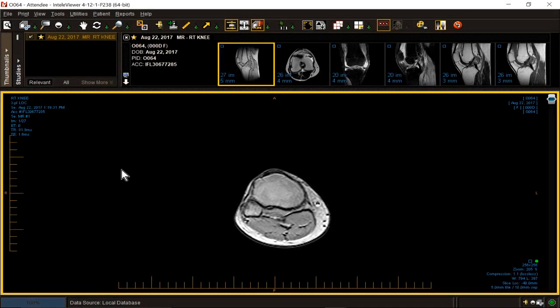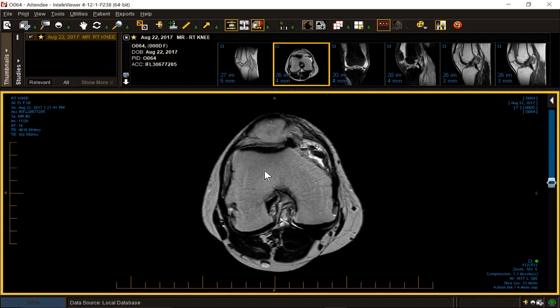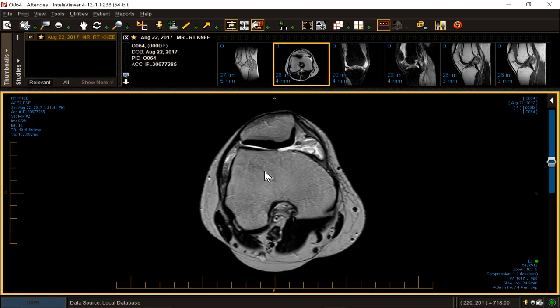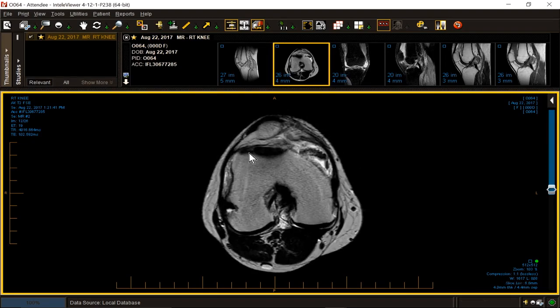Swollen knee, evaluate for meniscus tear. I'm going to go axial. We have a dysplastic patellofemoral articulation. Perhaps that contributes to intra-articular irritation. Irritation could produce synovial hyperplasia, something that looks like this. Hypertrophic synovium that's gray and irregular and beaded. It sometimes even looks like rice bodies.